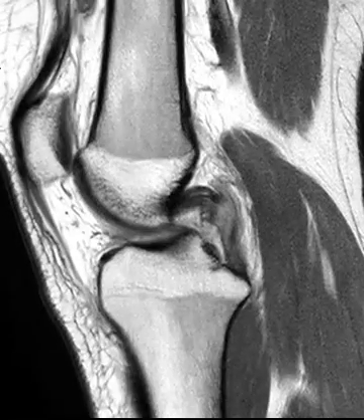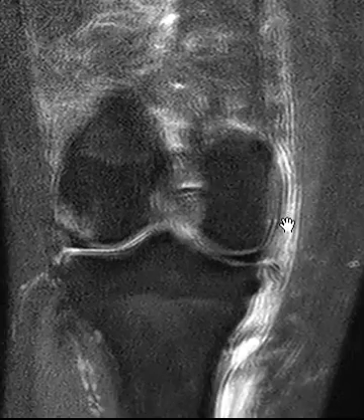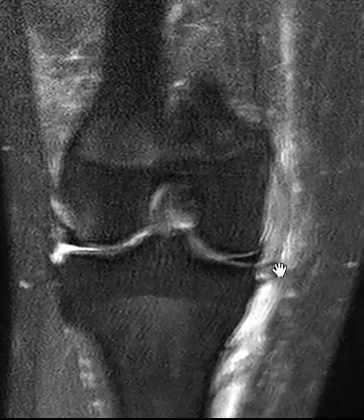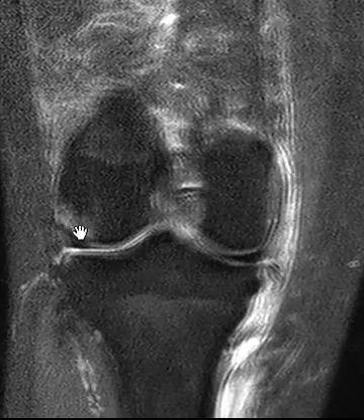And again, the common mechanism of injury, valgus stress injury, where there's distractive forces along the medial side with a tear of the MCL, often an associated tear of the ACL or PCL, and that typical bone contusion over here on the lateral side.